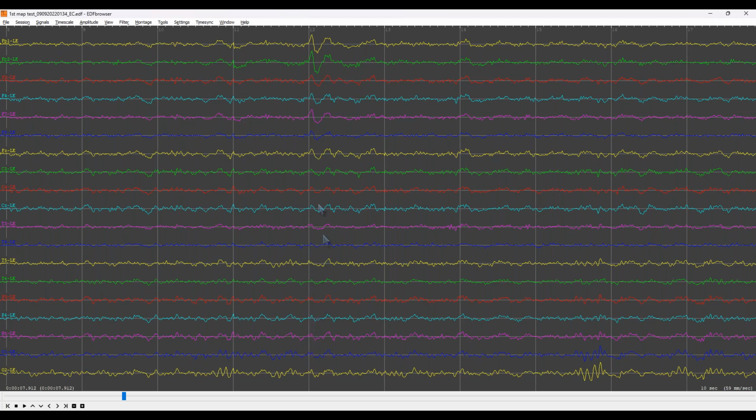It's showing up through all 6 of the frontal training sites, FP1, FP2, F7, F8, and F3, F4. We just see it going all the way through, and it's actually even affecting FZ here. And by the time that eye blink got to CZ, it's really dissipated. We really don't see much at C3, C4, the temporals. There are these little tiny bumps, but not like what we see up here. So if we kept seeing signals like this in a playback, we know it's something they're doing.